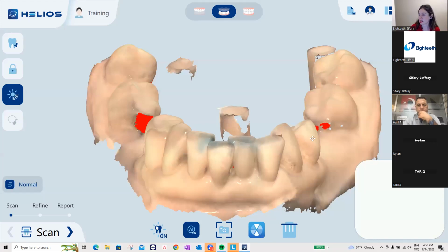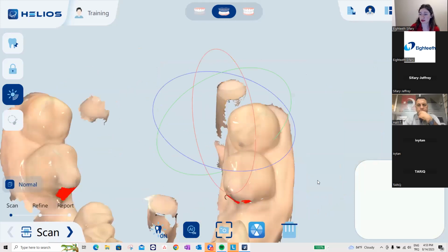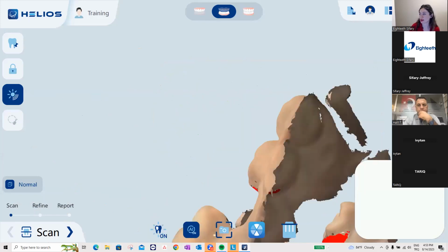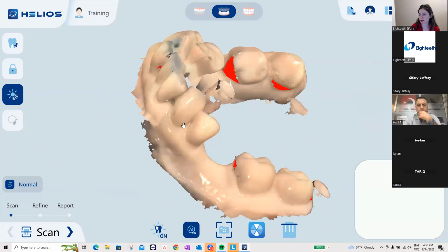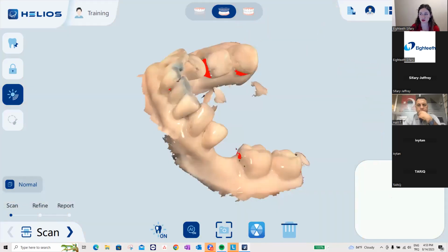And if during looking at the picture or the model, you lost how to go back, you can just make it into the center with this button, zoom fit, all right? Or you can just click and make it to center. It's very easy.